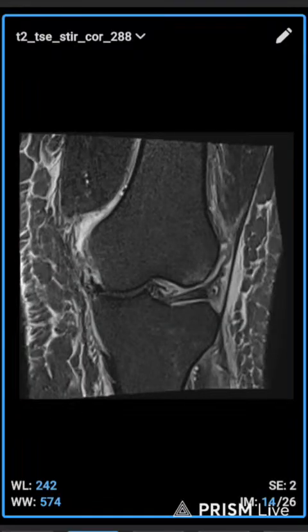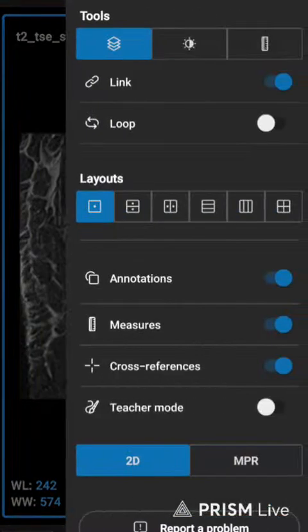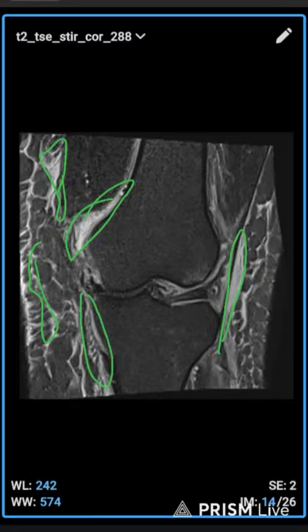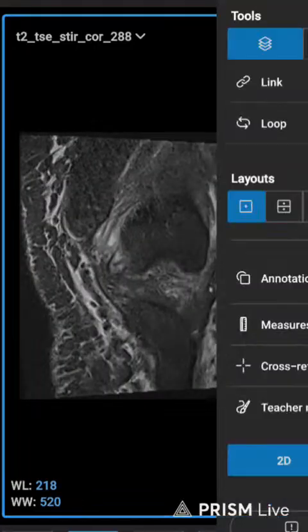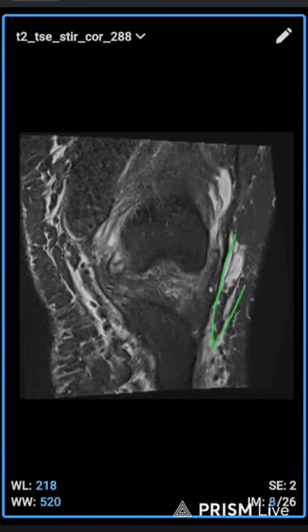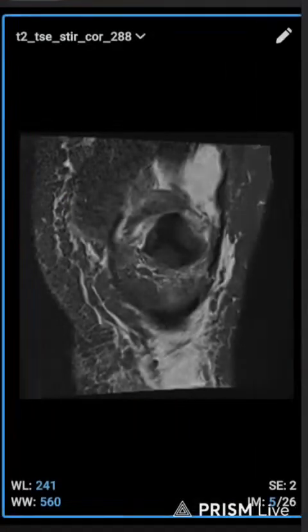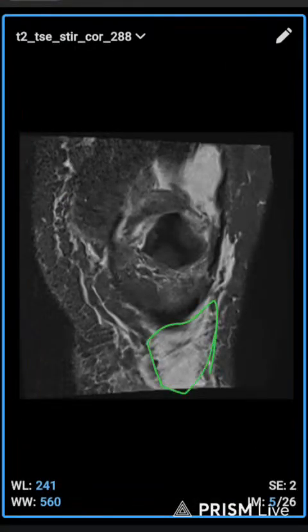Here you can see in this knee most of the area was edema, means there is a fluid in this muscle of knee. Here you can see everywhere in this knee shows brighter signal in STIR. It means this is the edema in this knee.